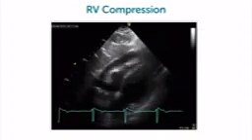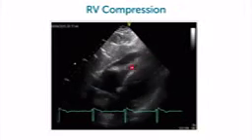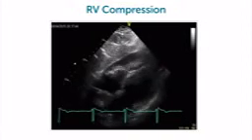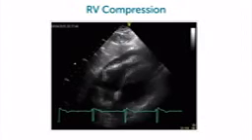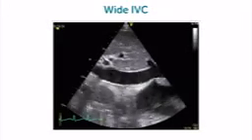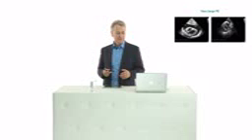And finally, in this patient, you will have to worry because now we have compression of the right ventricle. And patients usually develop symptoms in this setting. Again, a patient where the right ventricle was perforated during implantation of a pacemaker. In all of these settings, what you should be looking for is the IVC, because if you have a dilated IVC, this somehow speaks for hemodynamic significance of the pericardial effusion. So follow the IVC as well and take that into your assessment of patients with pericardial effusions.